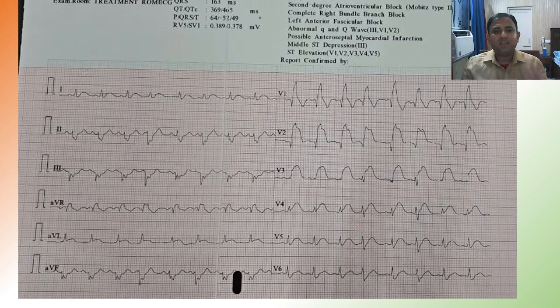So this was the initial ECG taken at the peripheral setup. So we know the definition of an ST elevation MI. ST elevation greater than 2 millimeters in the anterior chest leads, greater than 1 millimeter in the contiguous limb leads. But in this case, apart from that, another definition says कि the person may be having LBBB. Fresh onset LBBB is also suggestive of an acute myocardial infarction.